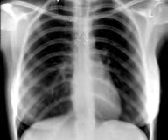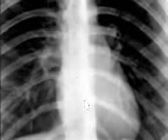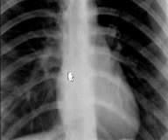Let me zoom it. Okay. So right main bronchus and left main bronchus here, they've got a mutual angle of less than 90 degrees at the bifurcation of trachea to suggest that there is no mass or enlarged subcarinal lymph nodes. We have ruled out cardiomegaly already.